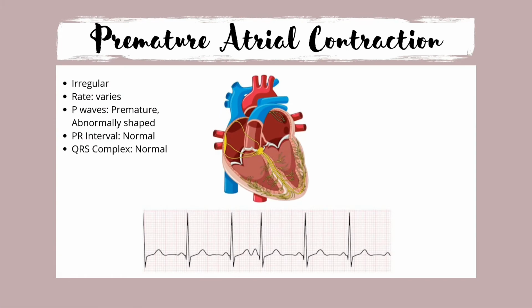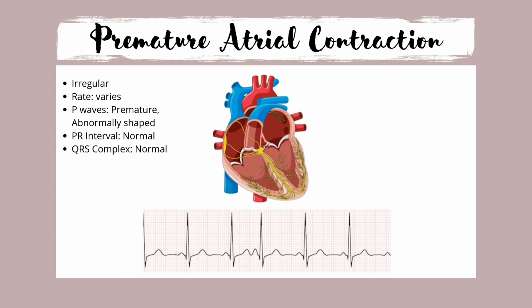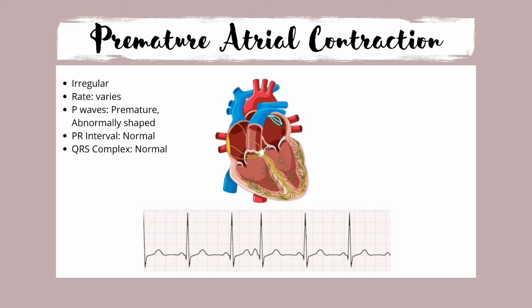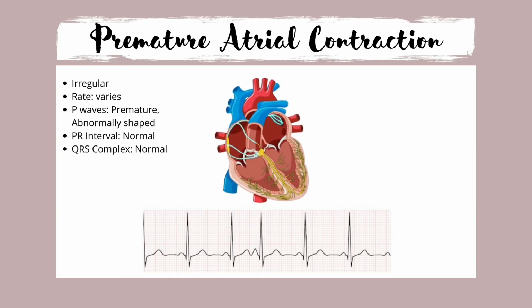A premature atrial complex (PAC) is a premature beat arising from ectopic pacemaking tissue within the atria. There is an abnormal P wave, usually followed by a normal QRS complex. Also known as atrial ectopics, atrial extrasystoles, atrial premature beats, atrial premature depolarizations.